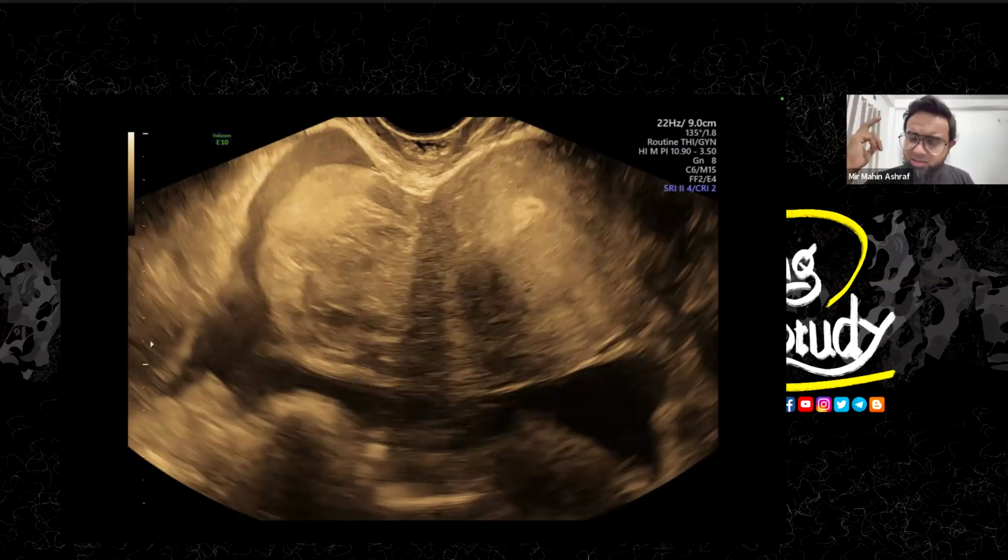As the ovary gets a dual blood supply from the uterine artery and the ovarian artery, it is not necessary to close both arteries to create a torsion situation. But if you want to drain the blood, you have to use a single channel of vein. So that's why in case of ovarian torsion, you won't see any venous flow inside the ovary, which is more preferable for the torsion. So in grayscale, you'll see the ring sign, and on color Doppler, you will see the absence of venous flow, which is more preferable for early or easy diagnosis.